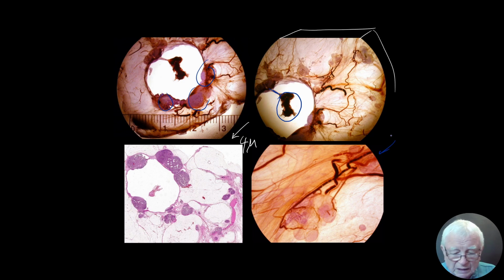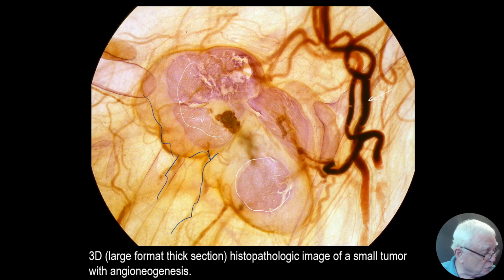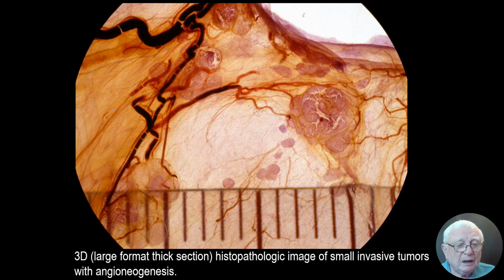But look at the 3D. It shows you the tumor vessels, the papillary cancer, and all these quickly produced tumor vessels that are feeding this cancer. I don't think that pathologists have ever seen these pictures because they don't produce this. That's why we are writing these books. Smaller than 1 millimeter carcinoma. In that picture I showed you, and here is a focus, and here is another one, another one, another one. Very rich picture.